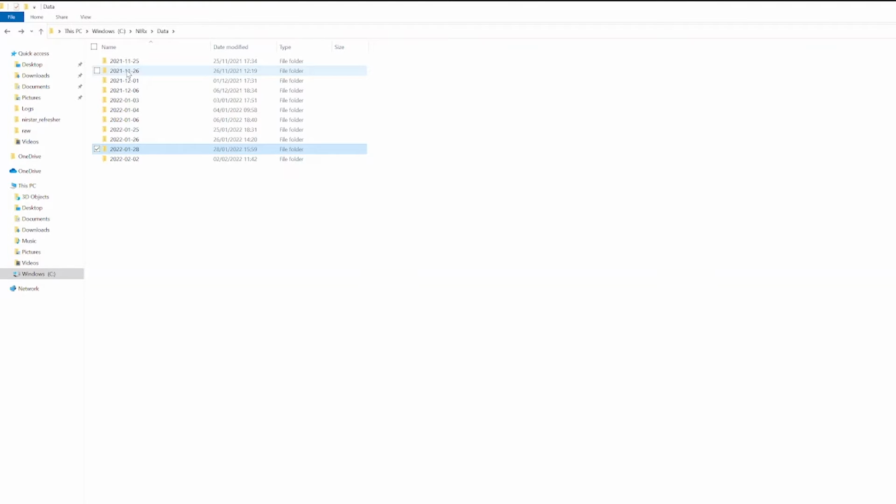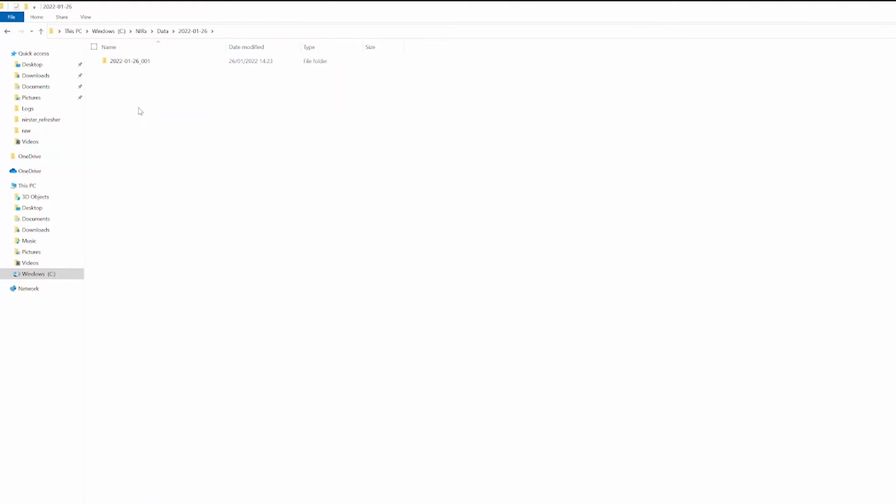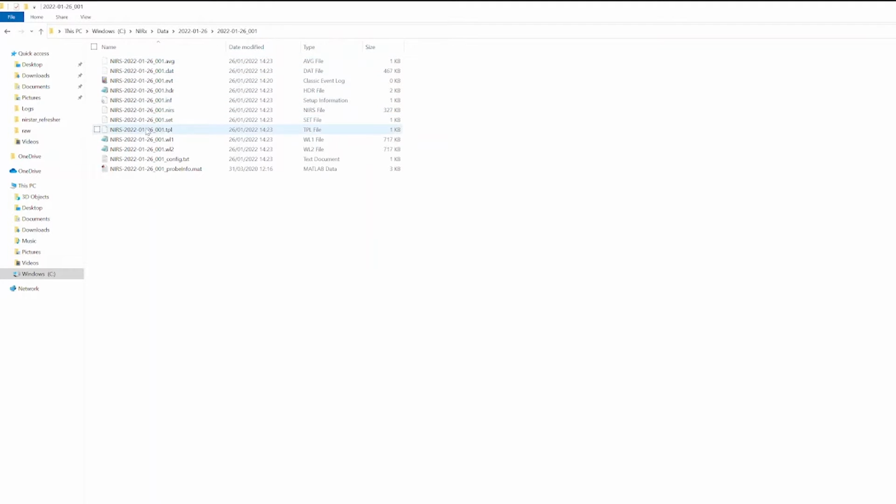These files include the detector readings WL1 and WL2, a header file with information surrounding the recording such as montage details and event timings, and other files which have redundant isolated information to the .hdr file, in case you want to check them individually. If you have selected the Export Data to Homer 2 format, a .NIRS file should also be present here.